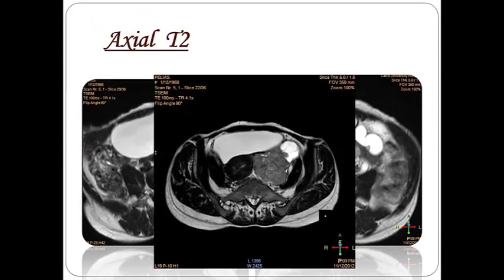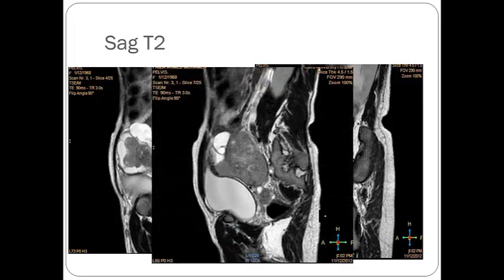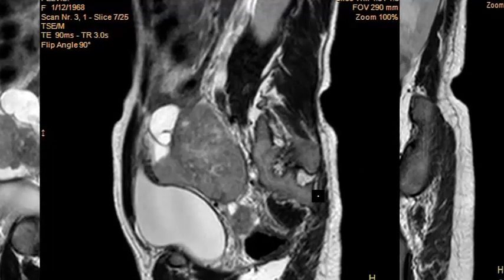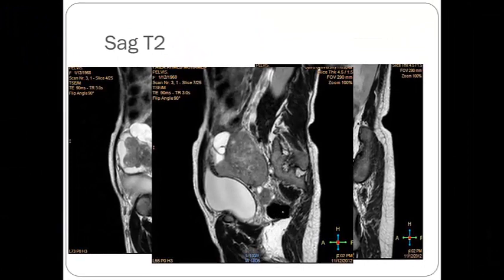When you find a complex lesion in the adnexa in a case of cervical carcinoma or endometrial carcinoma, usually think that it may be fallopian tube metastasis. Here, this is fallopian tube metastasis. Multiple lymph nodes are also seen in the adnexal region. Large lymph node, this is one, and this is another one. This is a picture of lymph nodes.